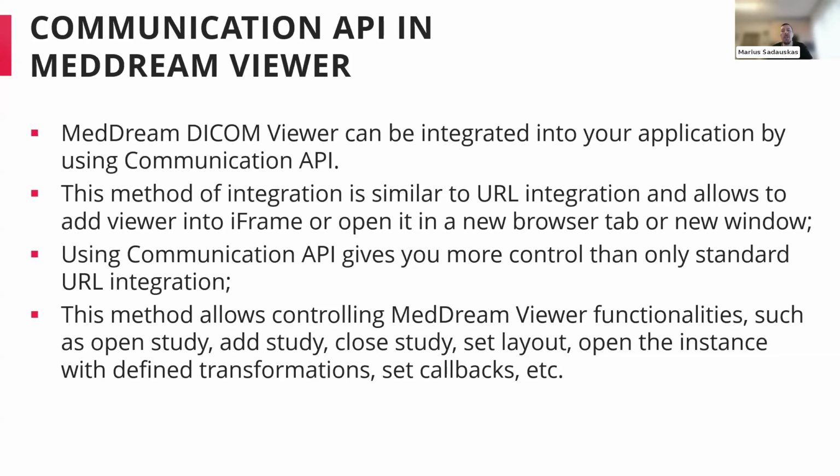However, the communication API gives you much more control than only the standard URL integration. It would allow you to have more controlling functionalities of the MedDream Viewer.